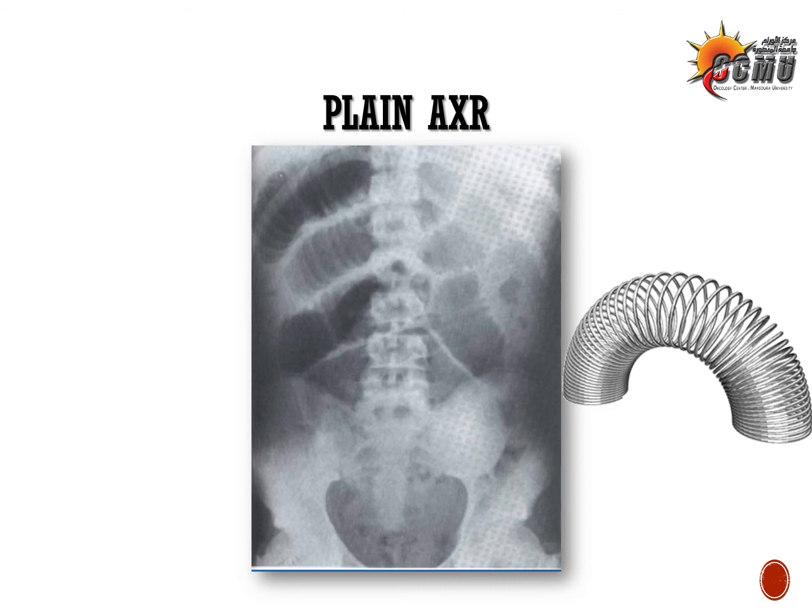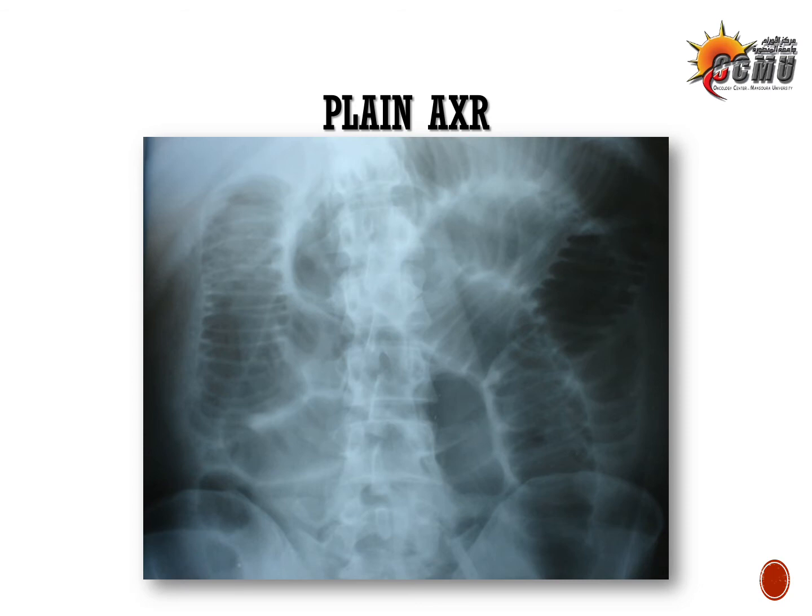Small intestinal bowel segments are seen in the upper left corner. That denotes small bowel obstruction. This is a very clear image, again, of the small bowel obstruction with coiled spring sign.